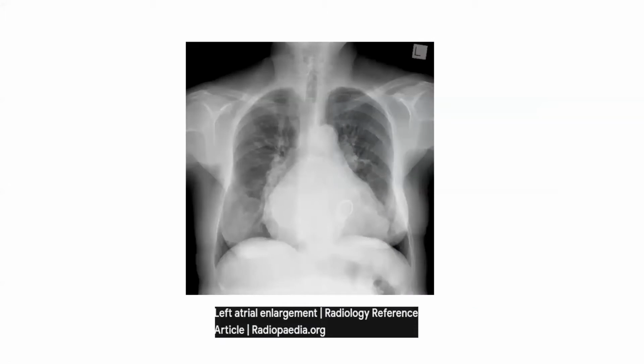Okay, what is this here? What is it? Mitral ring. Mitral ring. Thank you so much. There is a mitral ring. There are sternal wires, you see them here. Good. What else?